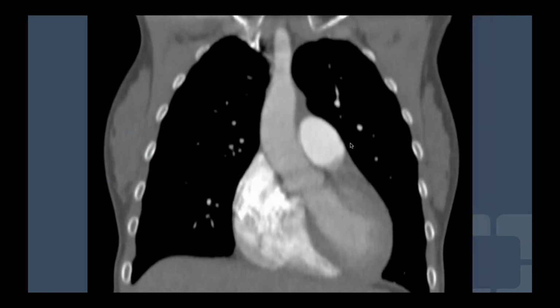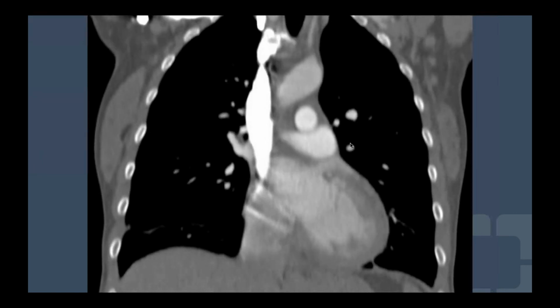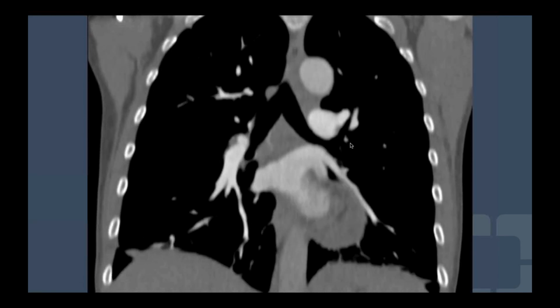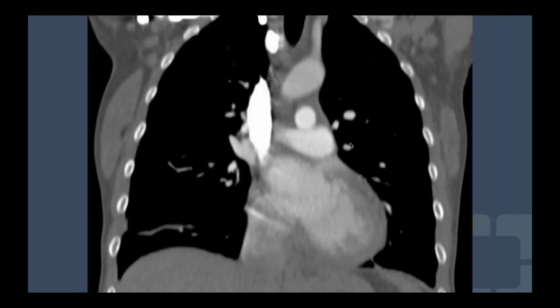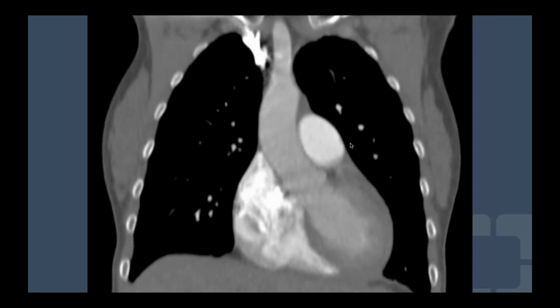We fixed it. Okay, so this is a 36-year-old female, HIV positive, with failure to thrive and no history of congenital heart disease. I'm going to show you a couple of slides. First, the axial movie. Just going to let it, well, the X-ray. Anything about the X-ray? Anything funny about the X-ray?